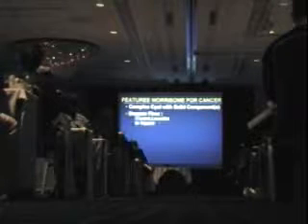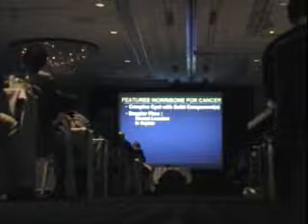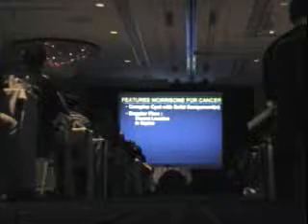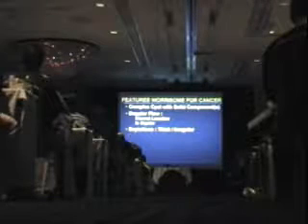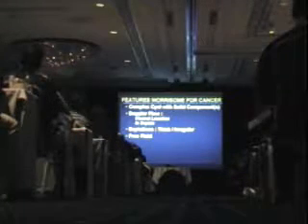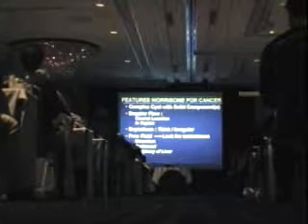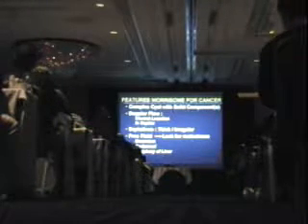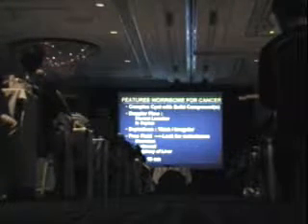So in summary, when we are looking at women, the features that we worry about are complex cysts with solid components. If we see Doppler that's central in location, in septations, or we see thick or irregular septations, abnormal amount of free fluid allows us to look for mets. Where are we going to look? In the omentum, peritoneal cavity, or in the periphery of the liver. You know where those tumors spread. And size. Most of them are more than 10 centimeters.